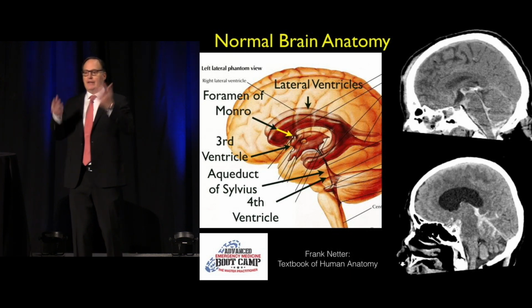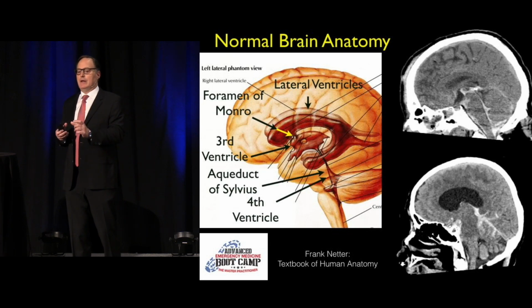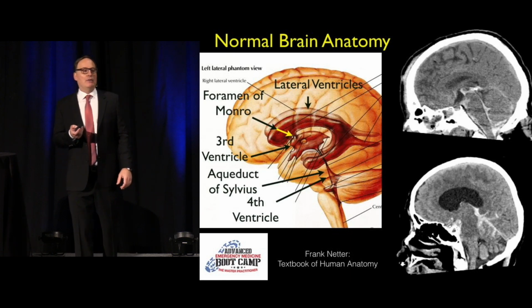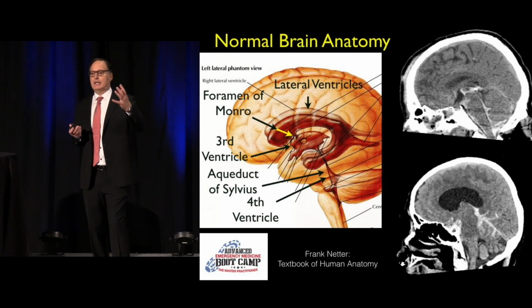So everything gets inflated, from above the third ventricle, but the fourth ventricle is small. Okay, so that's one way of distinguishing. That would be a non-communicating. A communicating one is where they're all communicating together, where it's basically all the ventricles are large.